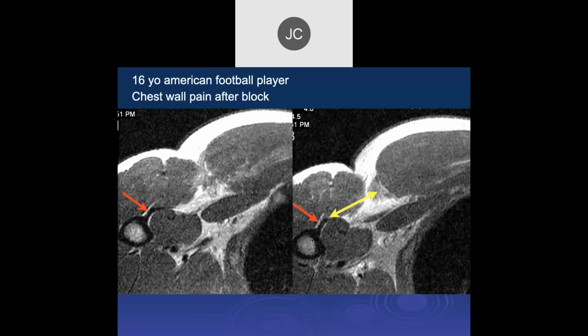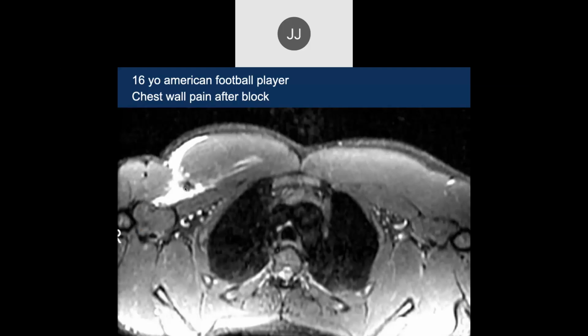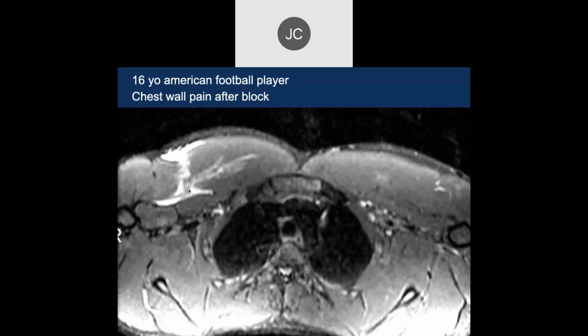So the tear here is at the junction between the muscle and the tendon. And you can't really suture it to muscle. The sutures won't hold; they'll just cut right through the muscle. So the question sometimes is if it's in the middle of the tendon, maybe, but tendon doesn't really heal very well. Again, the bone grows into tendon. Maybe a little stub at the musculotendinous junction, but most of this is a tear of the junction between the muscle and the tendon.